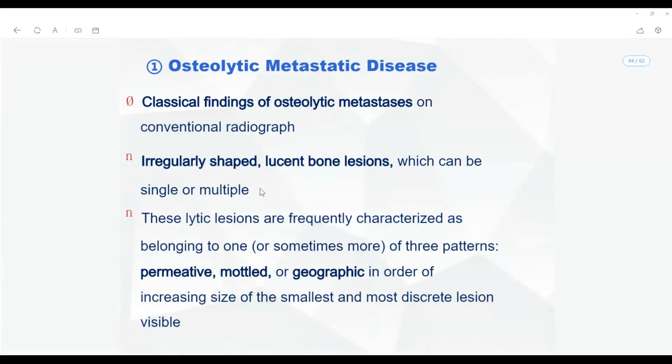Let me find you a picture of multiple myeloma so that you can understand. See, this is also called the salt and pepper appearance. It can technically happen in kids as well. Look at the image I have sent you.